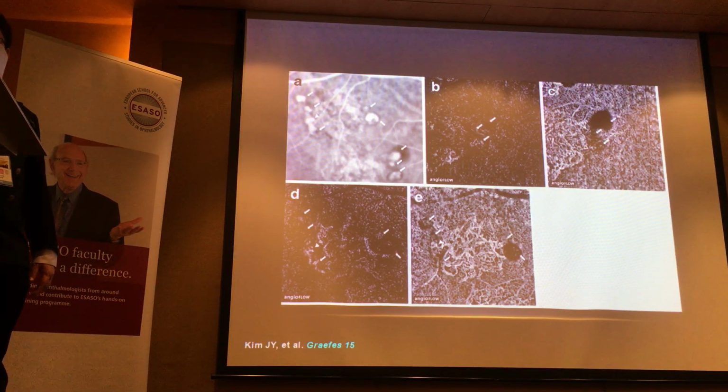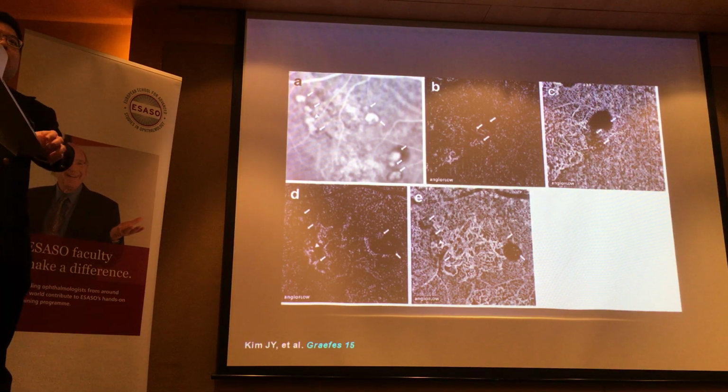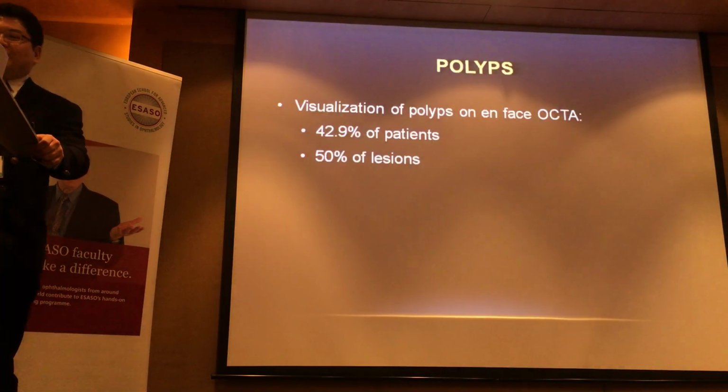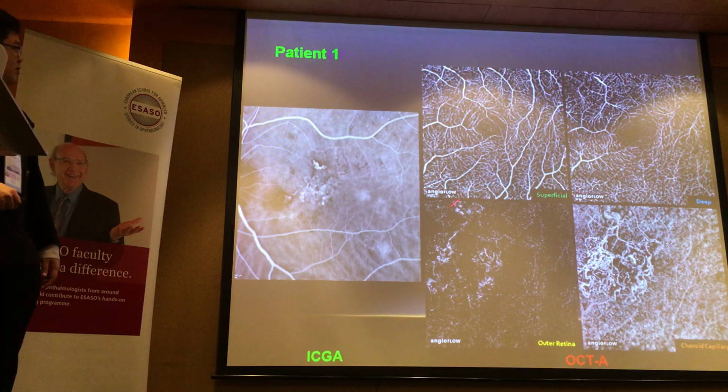Where would you apply the spot? You can do so presumptively, right? You can, but is that what we want to do? So that's the limitation of OCT-A in this sense. Okay. So this is an example of one of my patients.